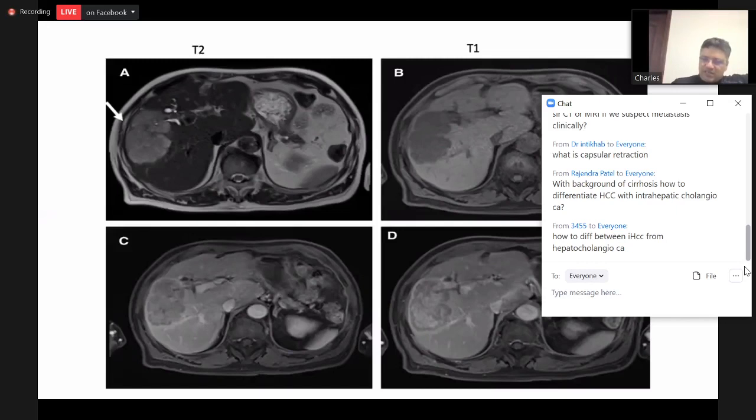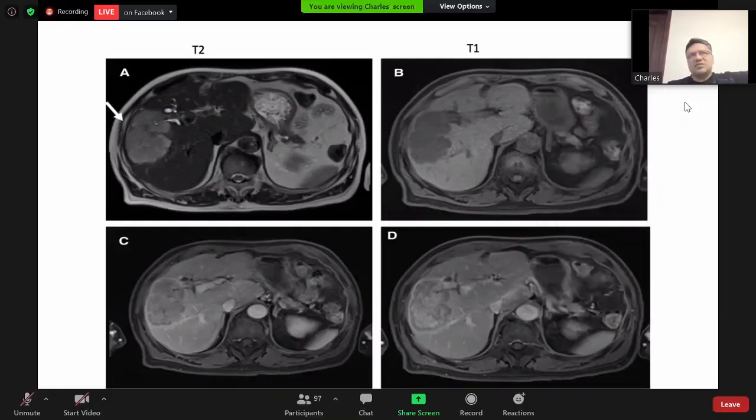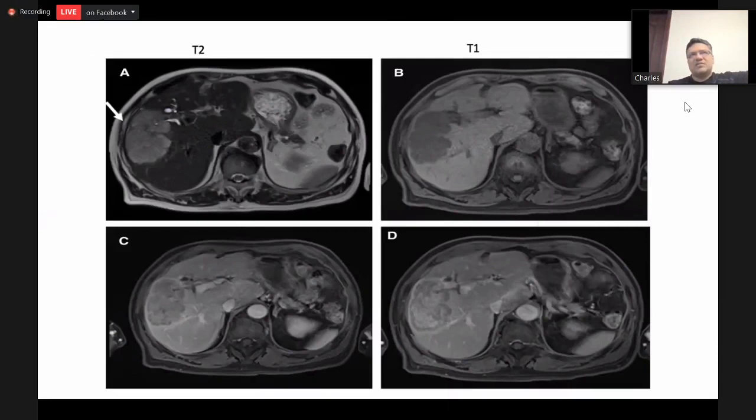Cholangiocarcinomas are sclerotic lesions. Sclerotic means there is a lot of fibrous tissue in them, and whenever there is sclerosis, peripheral cholangiocarcinomas tend to cause retraction of the liver capsule. So you can see the retraction of the liver capsule because of the sclerosis of the cholangiocarcinoma. These are fibrotic lesions, and fibrosis causes contraction of the liver capsule into the liver. So that is thought to be one of the diagnostic features of a cholangiocarcinoma. But rarely it can be seen in other fibrotic lesions also.